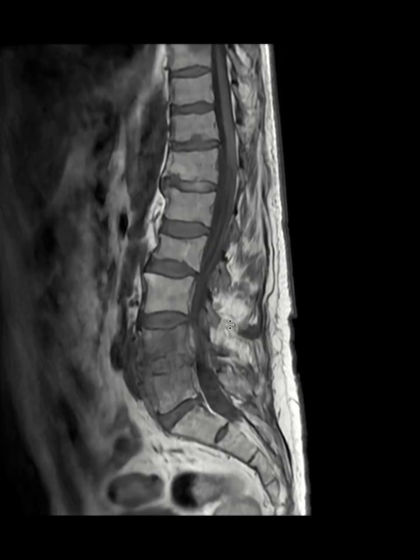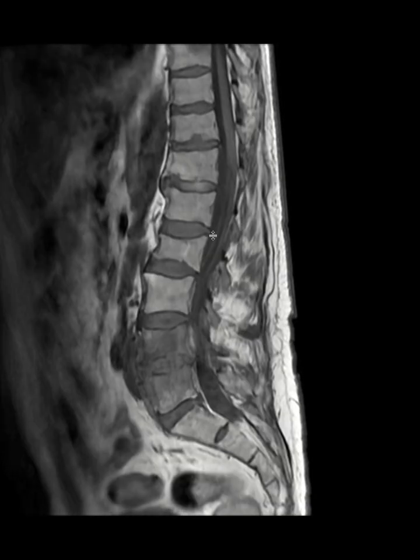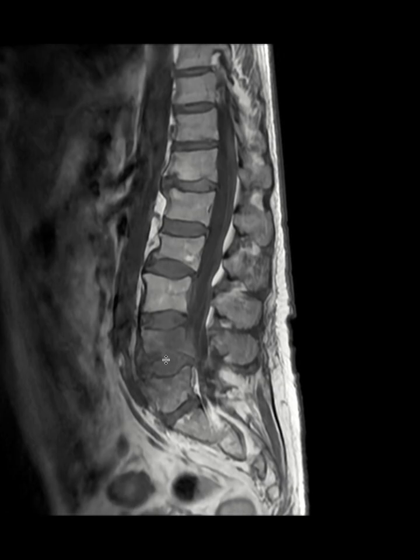So what sequence is this one? This is T1 bright, and the way I know is that in adult patients who don't have any disease, any anemia, or any underlying cancer, we have regular fat marrow in our bone marrow, so that's why it looks bright. This is a normal bone marrow appearance, and the subcutaneous fat is T1 bright, while the spinal canal CSF fluid is dark on T1. So this is a T1 sequence.